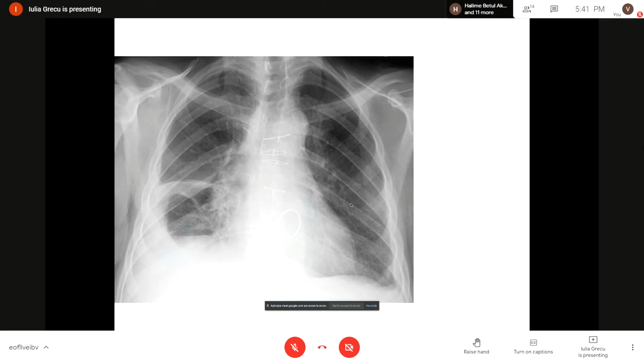Okay. So what's wrong? What do you see on this chest X-ray? Hang on. I see the spine is weirdly curved. Okay, forget the spine. It's a rotated frontal chest X-ray. We barely see the spine. It's not the point of this exam. Something else. And you also have to keep in mind what we discuss, because it's related to the subject, usually.